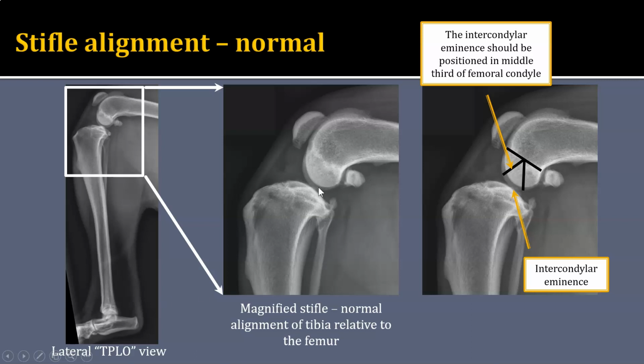This patient has some osteoarthritis changes from cranial cruciate ligament instability, and there is intracapsular soft tissue swelling of that stifle. There are osteophytes here, proliferation, and then some sclerosis on the trochlear ridges, the distal patella, the fabellae, and this patient has that osteophytosis here in the region of insertion of the cranial cruciate ligament. So that is our enthesophytosis or enthesophyte formation with some subchondral sclerosis. Now, this patient has normal alignment.